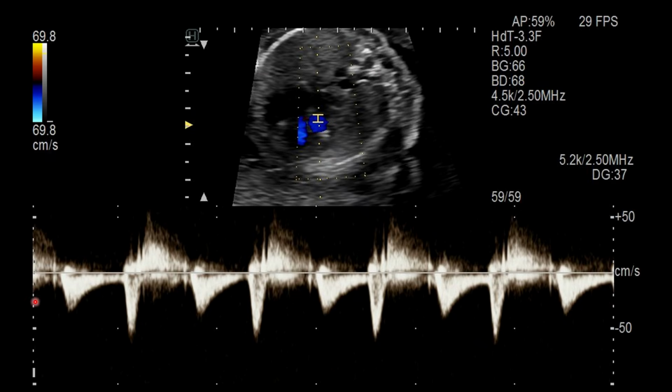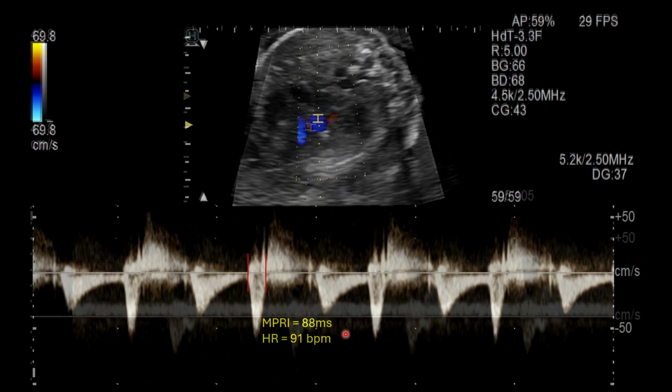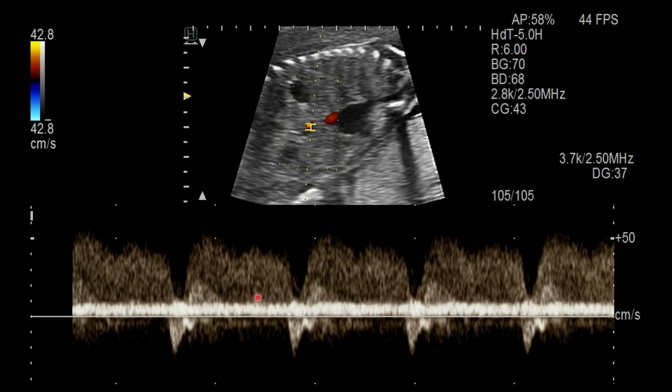A typical mitral valve inflow pattern for this slow rate, you have a very long early filling phase, and then in this case, a shortened mechanical PR interval, and we see that it's at 88 milliseconds. And so when we look at the DV, we can see signs of high filling pressures from that shortened mechanical PR. You have atrial reversal here, and you actually have ventricular systole onset before the end of the P wave, the atrial contraction, and so hence the notching on this A wave here.